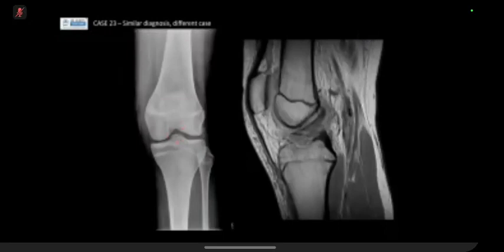Those spines are irregular. There will be quite a bit of soft tissue swelling, and a twisting mechanism of injury. And then often, if there's a lot of joint effusion, you just want to make sure that you do an MR. It depends on what the orthopedic surgeons want. Sometimes they say, actually, no, it will heal on its own, but often they'll say just do an MR to ensure there's no other internal joint derangement.